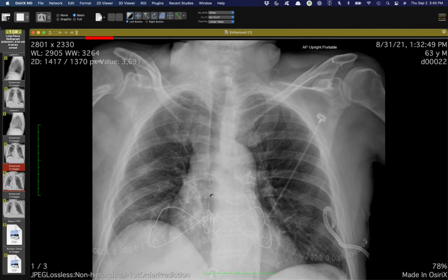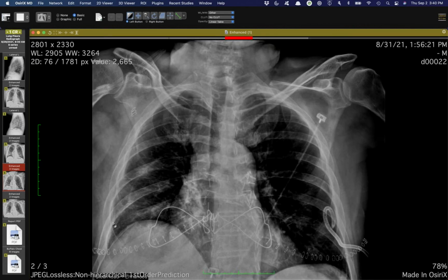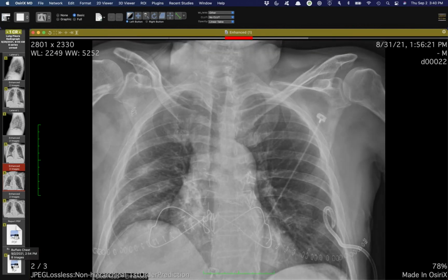I don't have a CT in this case, but oftentimes when we get CTs in the post-lung transplant period, you see the communication of the pleural spaces. So the behavior of this, with both of them reappearing and then decreasing with one chest tube, was typical of a buffalo chest. And one of my residents actually brought this up because we were discussing bovine arches and how that's a misnomer, that the human arch with two vessels isn't actually a cow's arch.